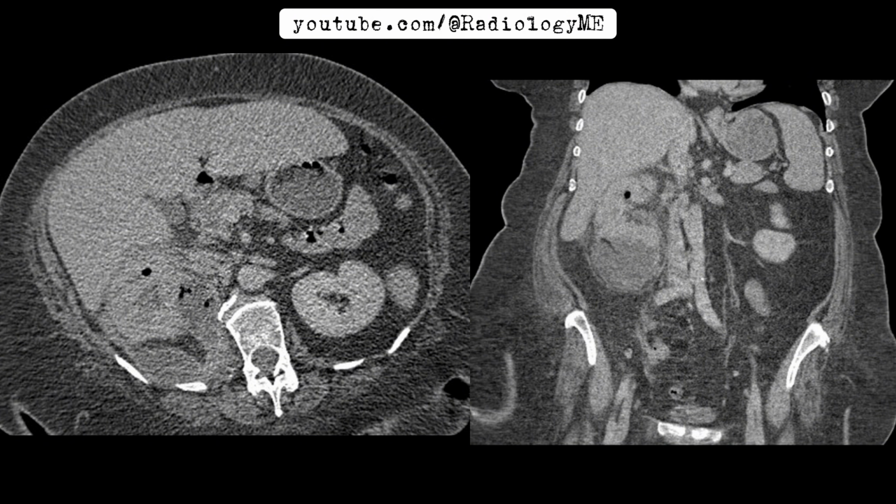Next, let's start piecing together some differential diagnoses. Based on the gas within the renal tissue, one possibility could be gas-forming renal abscesses, but that's less common unless there is severe infection. Another differential could be a severe form of pyelonephritis complicated by gas formation, possibly emphysematous pyelonephritis, EPN, which fits this patient's profile much better given her history of diabetes.